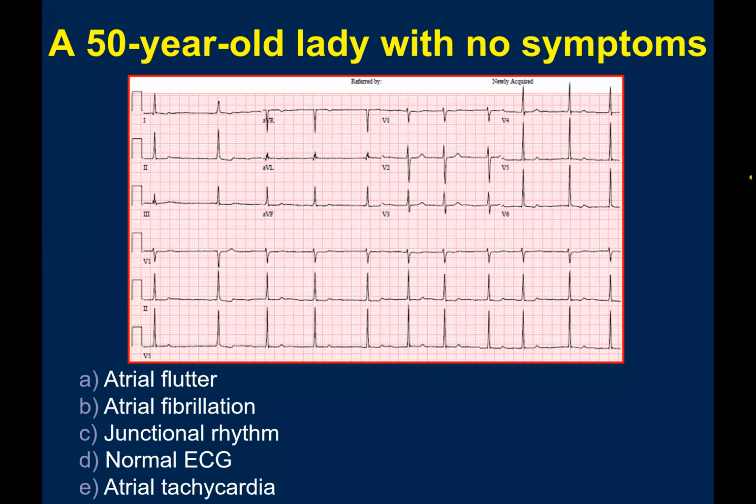In atrial fibrillation, from the R waves. Because if I take this R to this R, it is very slow. If I take this R to this R, it will be in the normal range. So how can I know the exact rate? We have to take many R's. That's the best way. If it is irregular, we have to count the R waves and then multiply them by 10. If regular, 300 divided by the squares between the R waves. But this one is irregular. We cannot apply the 300 divided by the squares.